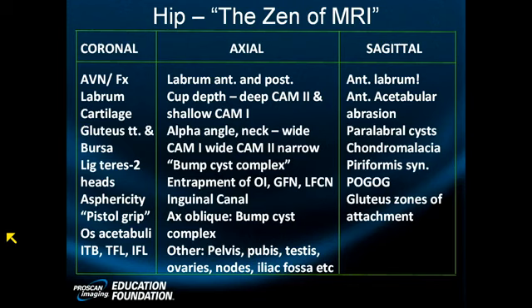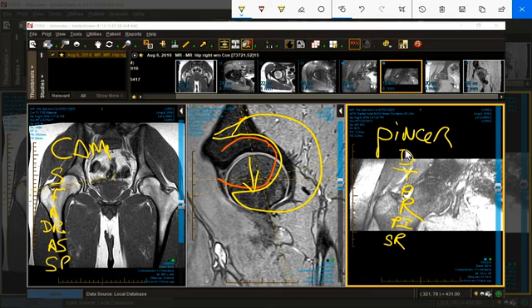But if this anterior wall extends out, I need yellow. If it extends out and it forces the femoral head back into a retroverted posture with hip flexion, that erodes the back here and produces innumerable erosions of pincer impingement.